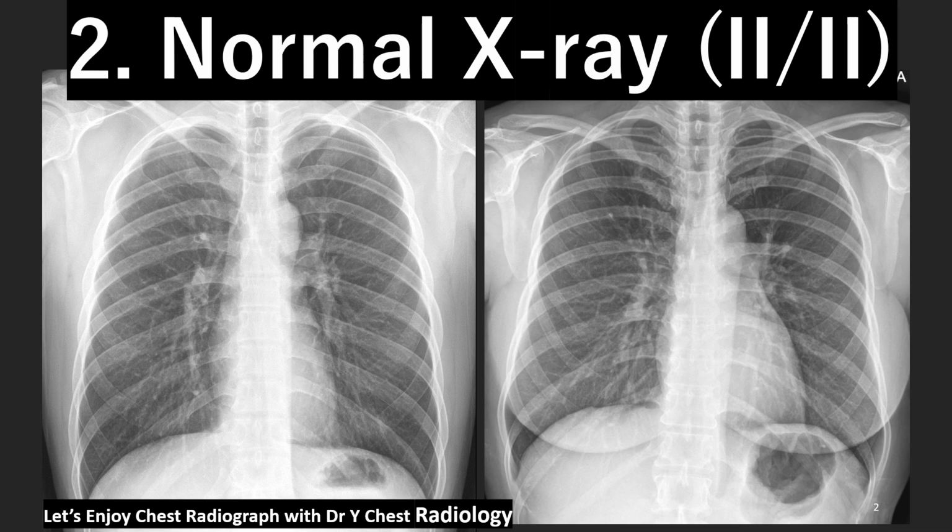For me, these two films are wonderful, great pictures, paintings of the great painter. These are the mother of normal findings. So if we see another film with abnormal findings, we have to compare everything with these two films.